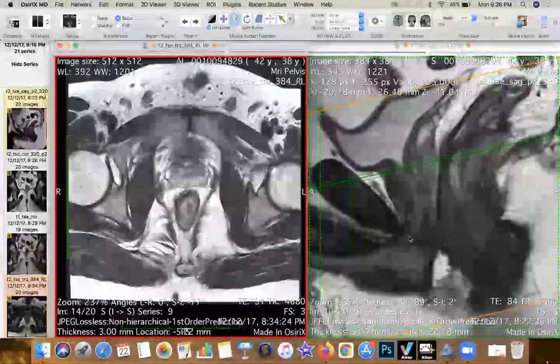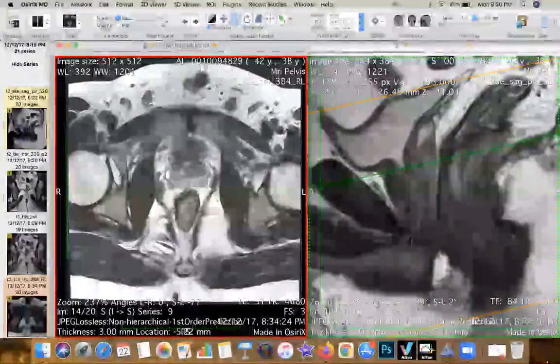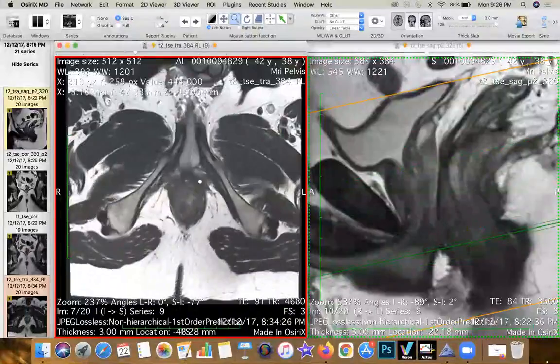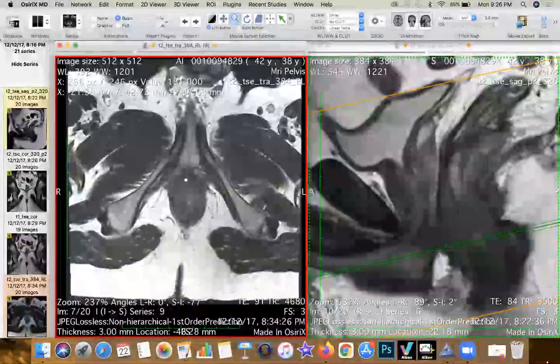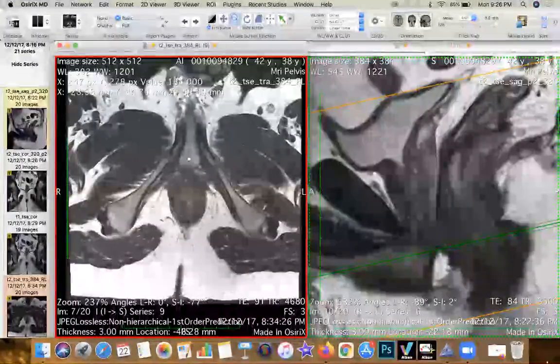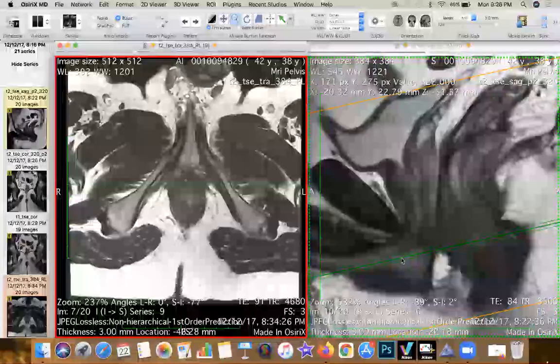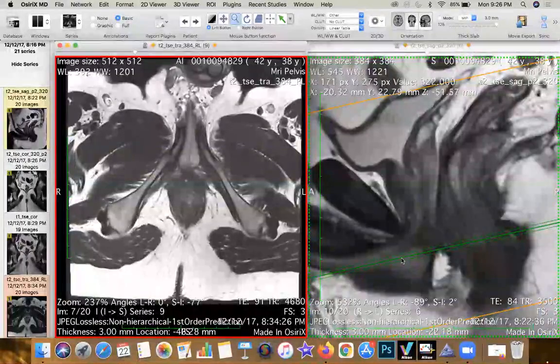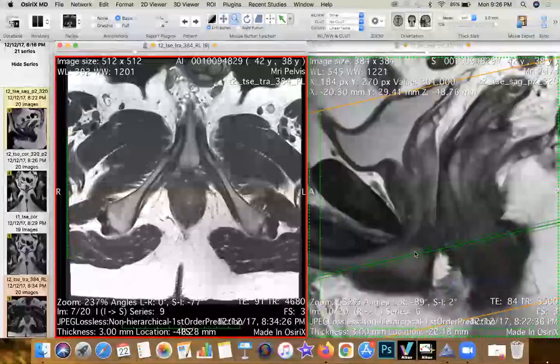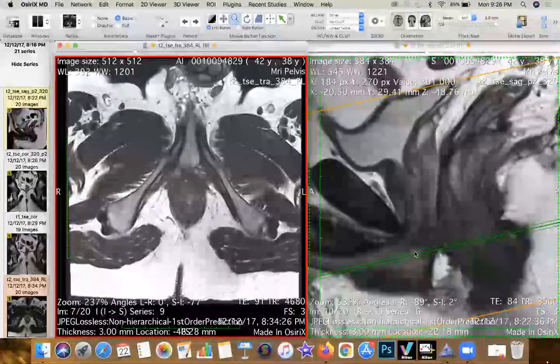What is the other structure? The superficial transverse perineae is also a very important structure. Now, if I were to show you where the muscle is, that is the superficial transverse perineae, which you can see in this location, attached to the perineal body and intimately related to the bulb of the penis. These are the key structures which are located out here. Of course, within the bulb of the penis, you'll have the beginning of the anterior urethra, which is coming up out here. So these four structures are very, very vital when you're assessing the superficial perineal space.